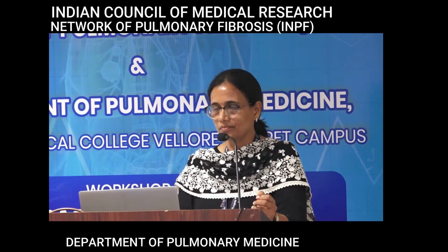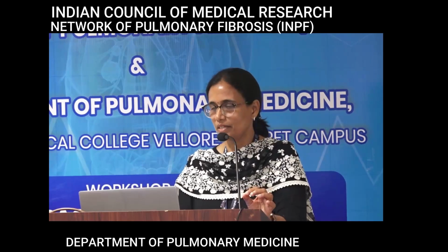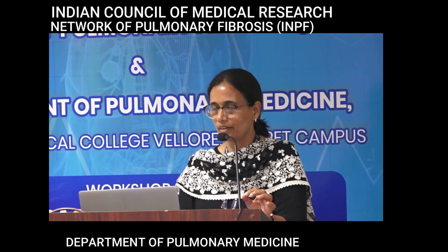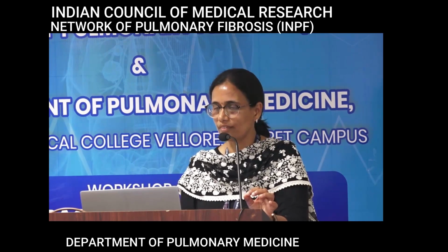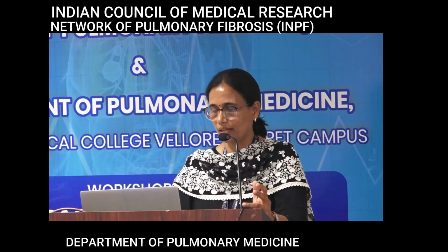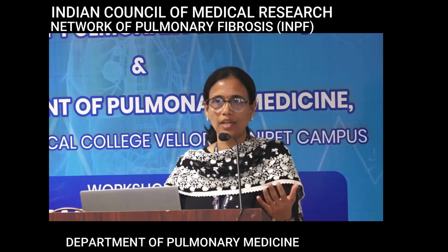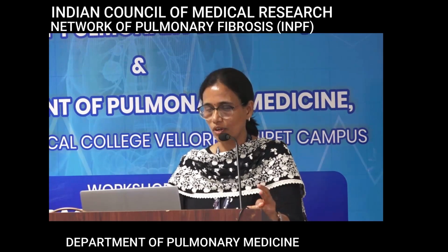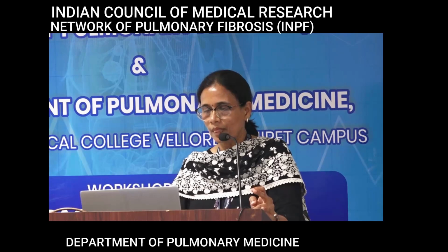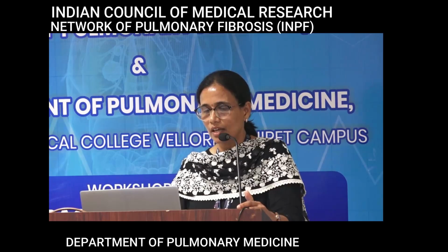So what do we see here? There are multiple cysts, and this one, if you see some of these, they are having the typical perivascular distribution around the vessels. There are also small ground glass density nodules kind of areas here. So this kind of perivascular cyst is typically described in LIP or lymphoid interstitial pneumonia. We know that it can again be idiopathic or can be associated with Sjogren's or HIV. So again we'll see other examples of cystic diseases.